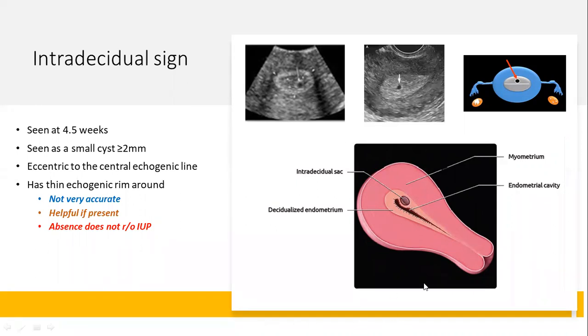It is not advisable and not reliable to diagnose early pregnancy failure using a transabdominal probe, because the resolution is reduced as the sound beam has to pass through many structures before it reaches the uterus and eventually our gestational sac. We might also be dealing with obese patients.